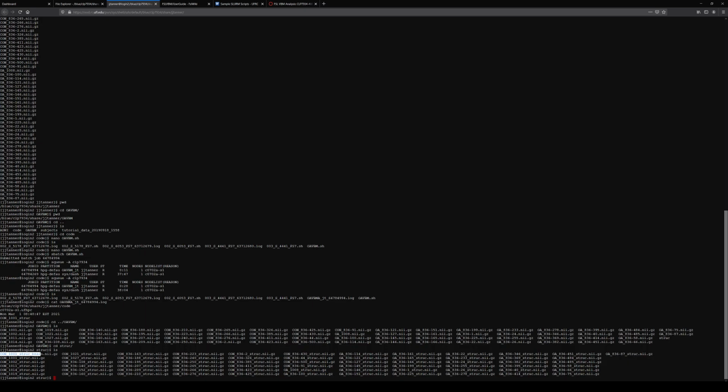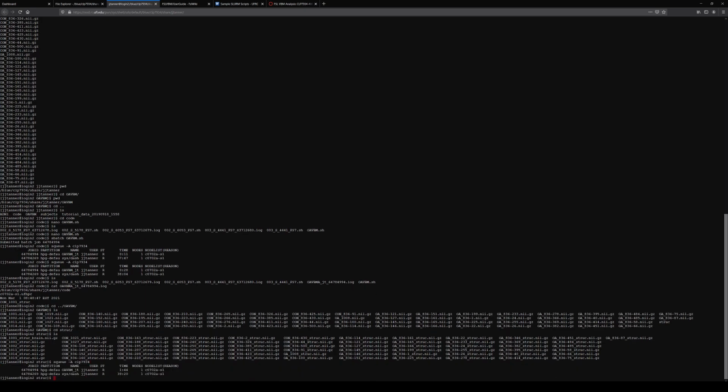So we can see the first participant has a brain on the end. So this is brain extracting. And so that's doing the first step. Hasn't caused any issues, hasn't run into any issues yet. And I can still verify that it's running. It's been running now for about 2 minutes, so we should be good to go. So that's the first step. And then once this finishes, then we can do the rest of the analyses. And so that's going to take a while. So the video for that will be coming later.